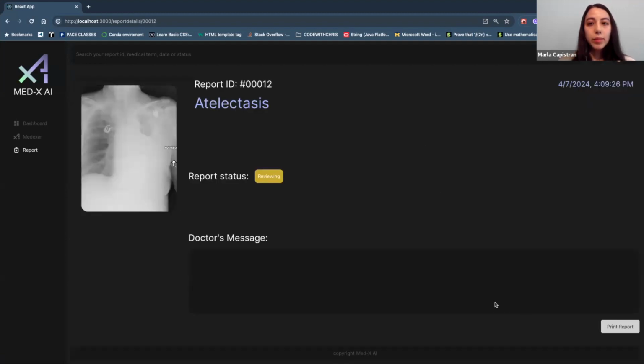At this time, Angela may choose to print her preliminary report. However, it still needs to be validated by a doctor. In order to print the report, she will click on Print Report.